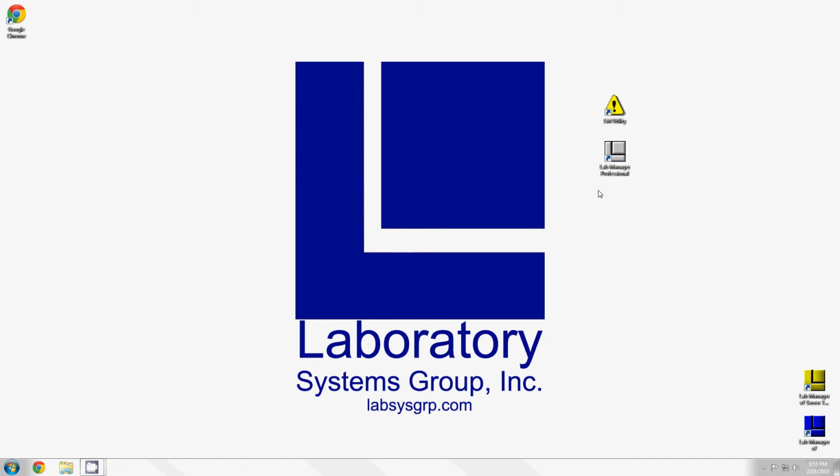In this tutorial, we're going to discuss backing up and restoring data in Lab Manager Professional. If you already have the program installed, you may be familiar with the gray icon that you normally click on to open up the program itself. The yellow triangle icon that comes with it here is the LM utility. This is an extra set of tools that lets you back up data, restore data, and do a couple of other things. We're going to double click that LM utility.